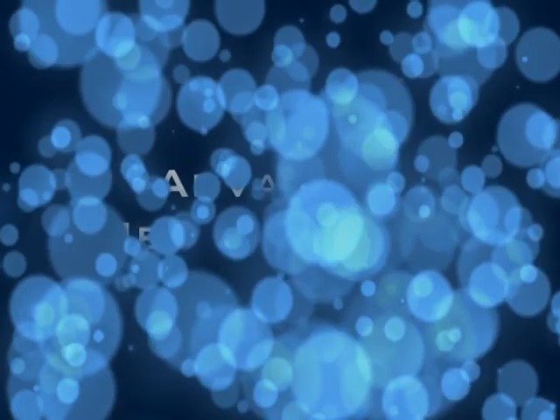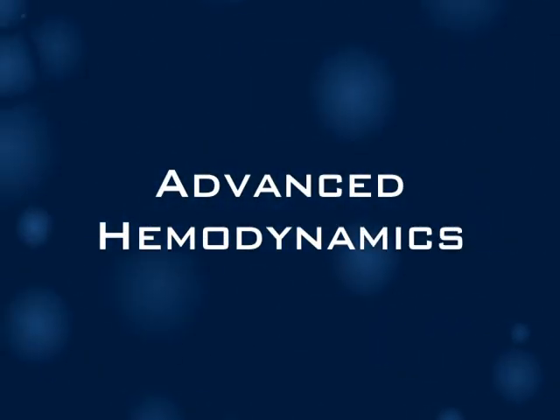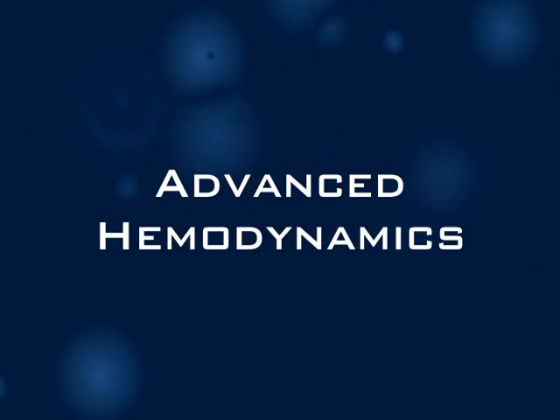I'm going to talk about advanced hemodynamics. We just covered some of our basic information. In this segment, you're going to see some unusual tracings, but of common problems that the cath lab should be familiar with.